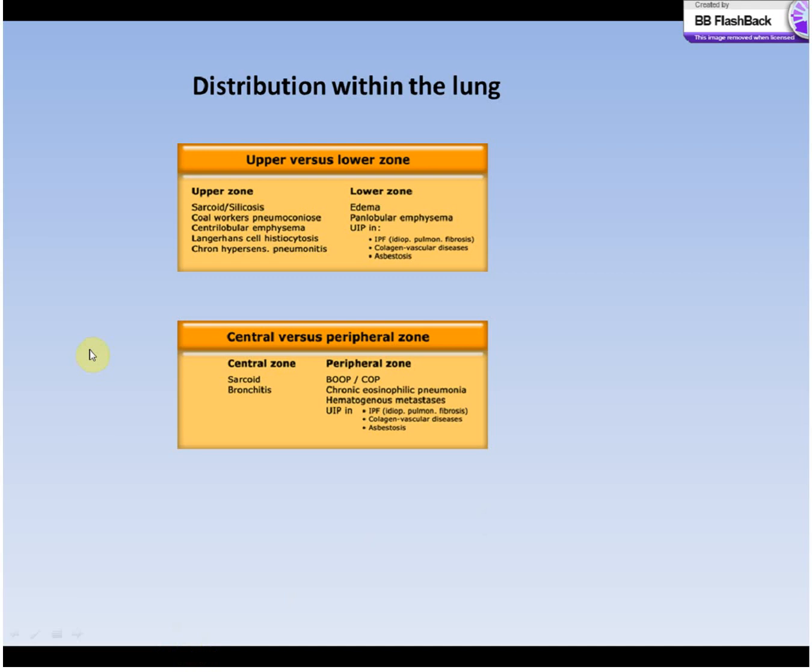And I'm not going to go through this differential, you can do this on your own. But there are certainly certain pathologies that like to follow distributions more so than others, and you can use this information along with the pattern that you see to narrow down that differential to a provisional diagnosis that makes sense based on the history and physical.